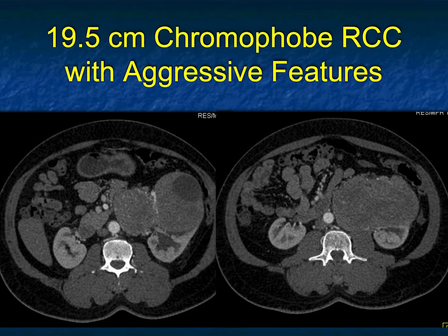Interestingly, this ended up being a chromophobe with aggressive features. Chromophobes often have a central scar. Oncocytomas have central scars. I've never seen a chromophobe this large, though I thought I would share it with you. Not the diagnosis I made, or even in the future will make again.